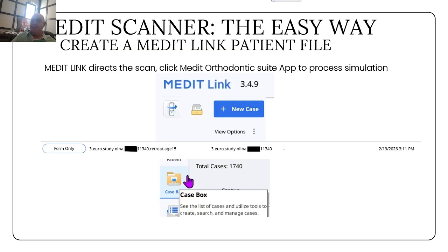Okay, so let's talk first about the Medit scanner as being the easy way. If you have the Medit scanner, this software, the Medit Orthodontic Suite, has been created by the Medit programmer. So of course it works the best with Medit. The main software is called Medit, and Medit is available to anybody free. You just download it. At the moment it is version 3.4.9.